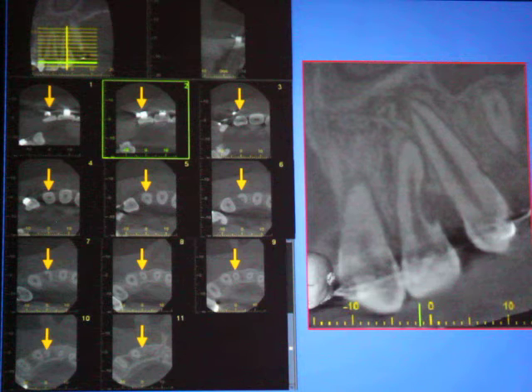So that is not only one view that we get. If I have to give you an example, that's the lateral incisor, and we can see this tooth from the axial view at different levels, starting from the crown to the root of the tooth. As you see, there is an orthodontic bracket on it, and as you see that tooth in sequence, you can see the defect appearing here, and you can see the shape and the location of the defect, and then once again at the root portion it is a complete circle here, indicating no defect.